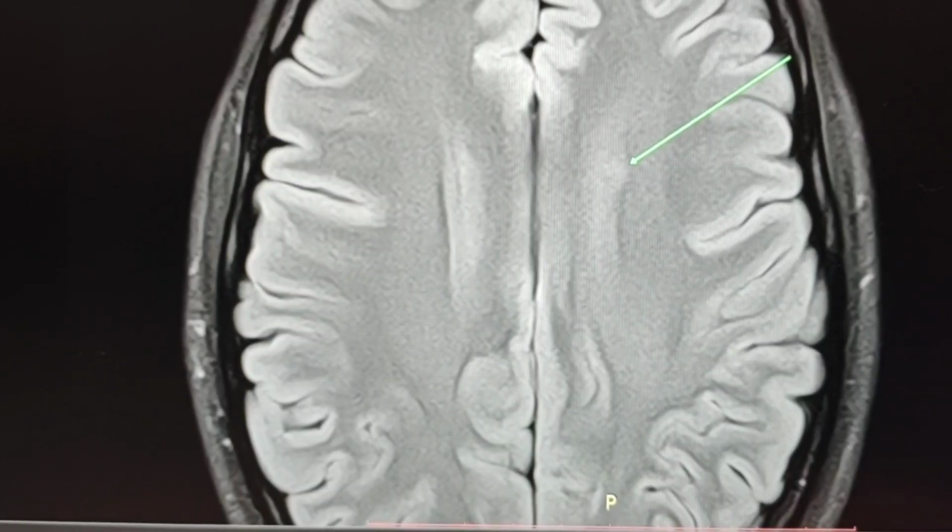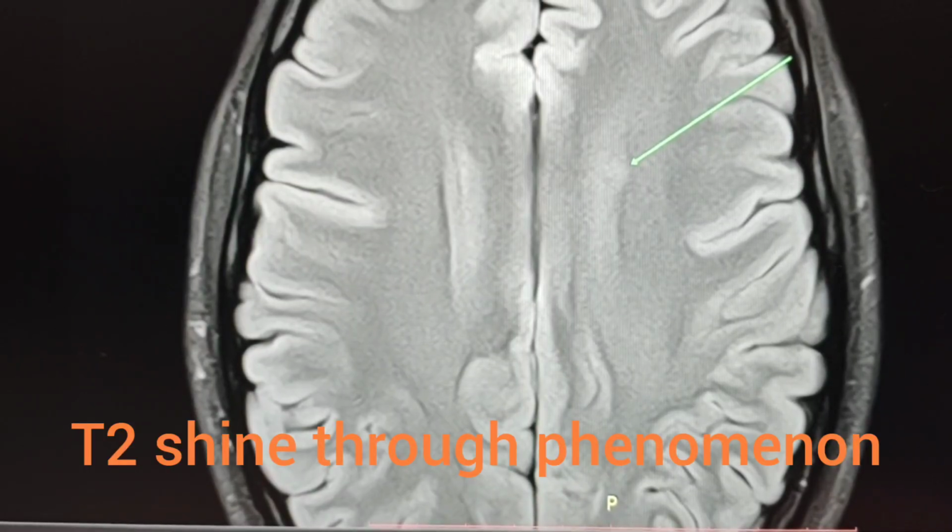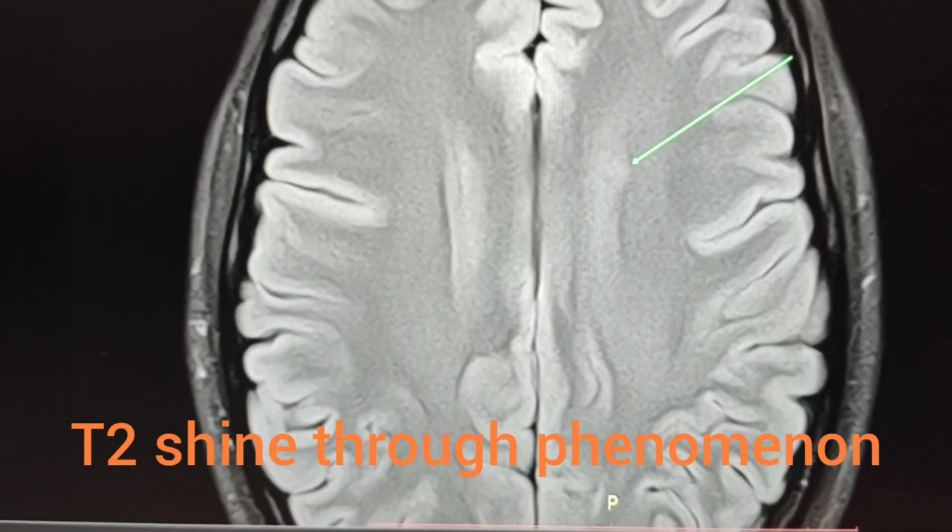Hello dear friends, today we can discuss the T2 shine-through phenomenon. I have an example here and it's a good opportunity to share it with you.